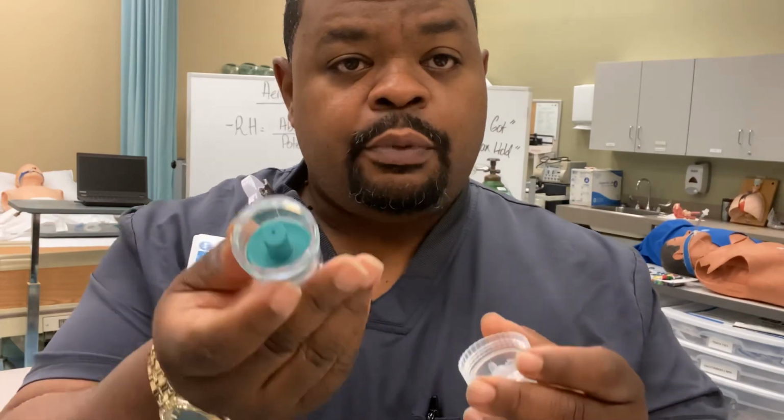They move mucus, right? But also when we get into our bronchodilators and our oral corticosteroids or inhaled steroids, we can even do inhaled antibiotics like gentamicin and tobramycin. You'll learn those later. But we put them in here, right? We use a small ampule and we take off the top and pour it in here.